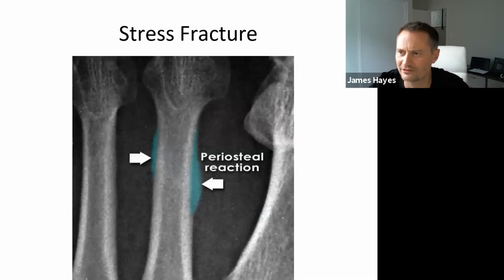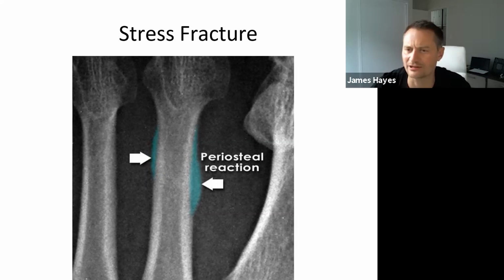Stress fractures, long-distance runners. If someone comes in to the department where you're working and they're a long-distance runner and they've got sore mid-feet, you're looking for stress fractures. Very, very difficult to see because they happen over a long period of time. And what happens is the fracture is kind of healing as it's happening. So the bone just gets a little bit bigger and a little bit whiter on the outside. And they're just basically told to stop running.